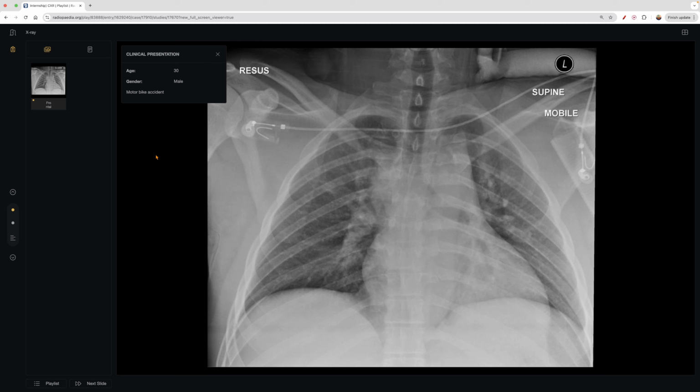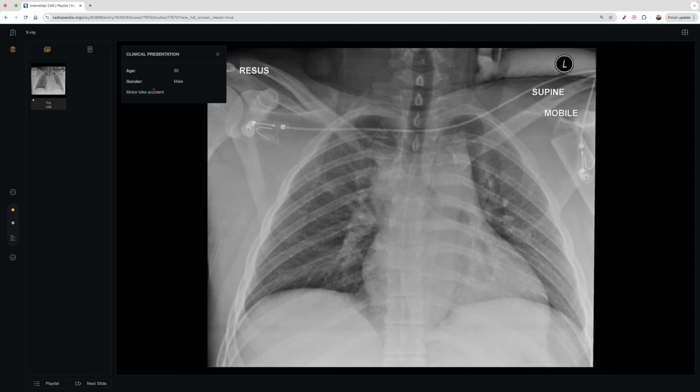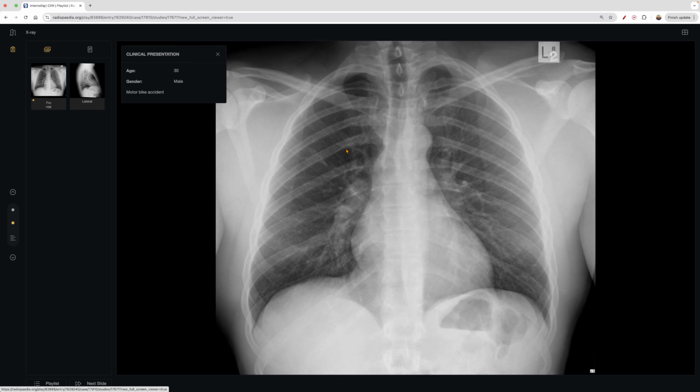And we'll talk about inspiratory volume in a second, but let's see what happens when the patient gets a PA image. And my goodness, look at the difference. The lungs are completely different looking, and for it being the same patient, it's impressive to see how different it is. On one hand, especially with a motor vehicle accident, this would be concerning, right? We'd be concerned about the widened mediastinum, maybe something going on in the lungs. And then come to find out, it's just the quality of the image. So that's important to take notice.